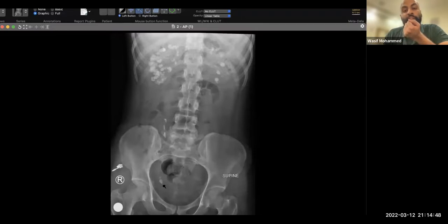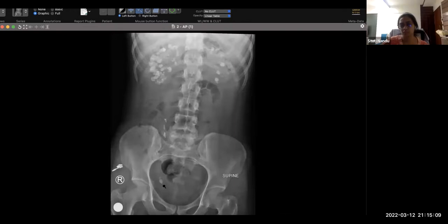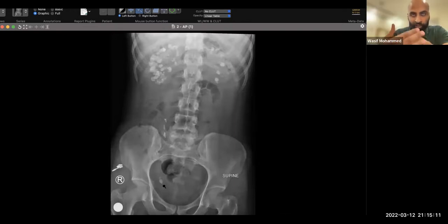that, and then you don't just stick with one diagnosis and close the case. I think the first time when you were speaking, you just spoke about hyperparathyroidism, and then you just went into management and just closed the case. So that would be a mistake in the exam. You need to go step by step: positives, pertinent negatives, clinical history, interact with the examiner a little bit, and then close the case, saying the most likely diagnosis over here is that of medullary nephrocalcinosis, and the differential for most likely diagnosis is medullary sponge kidney.